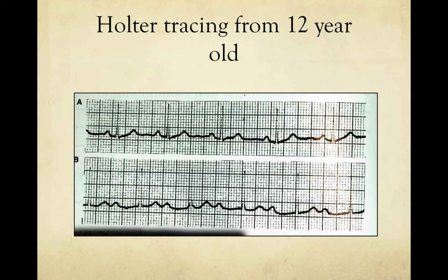So I'm looking at the strip which is labeled as A, and B. I think this is a continuous strip. It's a very old strip, so I apologize, but I believe it's continuous. Or actually, I'm wrong. They're two different times. So yes, excuse me for interrupting. I'll now shut up.